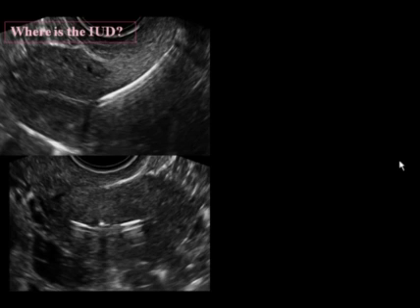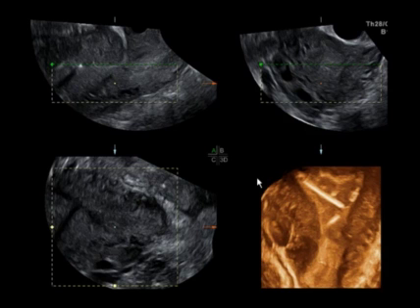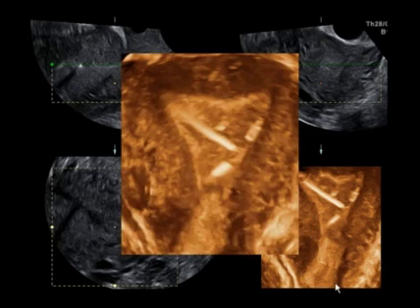Here's another one. Where's the IUD here? Well, we can see that the shaft is in the center of the uterus, a little low, and here are the arms, but what we can't see is where the uterine cavity is. So when we look at a 3D, we can see that the uterine cavity is depicted a little brighter, and the IUD is oblique within the uterine cavity. The uterine cavity really wasn't big enough in this patient to accommodate the IUD. Now here we are with 3 orthogonal planes, and what we have is an IUD that is actually upside down and backwards in a sense, where it's headed down instead of up. Very abnormal in appearance.